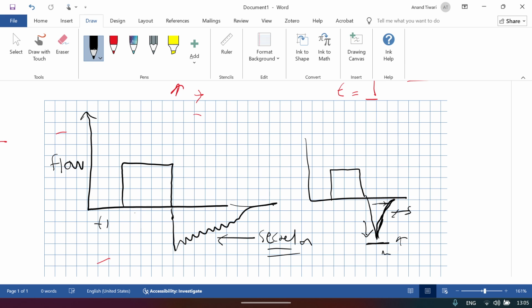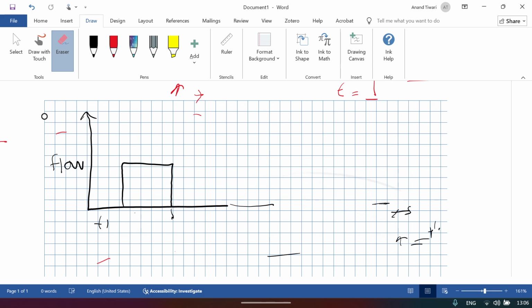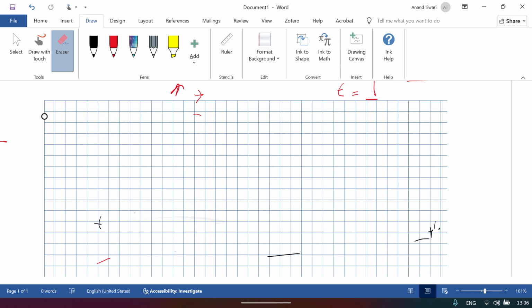So that's why you don't see auto PEEP in an ARDS patient. We increase the respiratory rate up to 20-24 because these are stiff lungs. They will empty fast, with an increase in the peak expiratory flow and short expiratory time. So we see this pattern in a patient with a compliance problem, or low compliance. So from the expiratory limb, whether it is pressure control or volume control, the expiratory limb morphology will remain the same, and you can identify many problems related to resistance, compliance, and secretions.